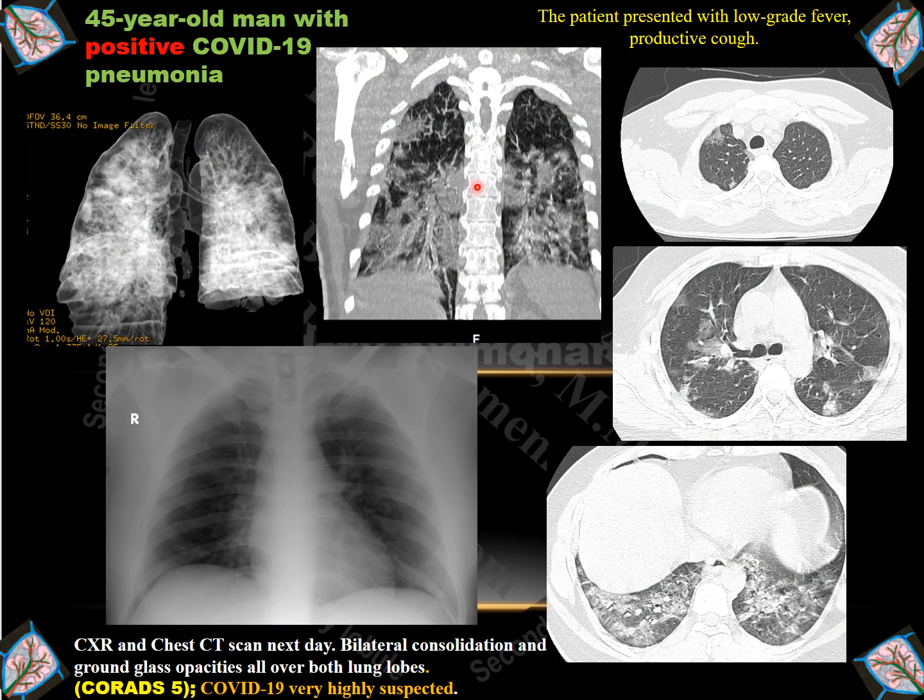Another COVID-19 positive case, a 45-year-old man, showing multifocal areas of ground glass opacity in the HRCT, seen in the upper lobe, the middle lobe, and the superior segment of the lower lobe. There are areas of consolidation, as we cannot differentiate the pulmonary vessels through the opacity. And this is the coronal format and volume rendering study, which confirmed the diagnosis, confirmed by PCR as positive.